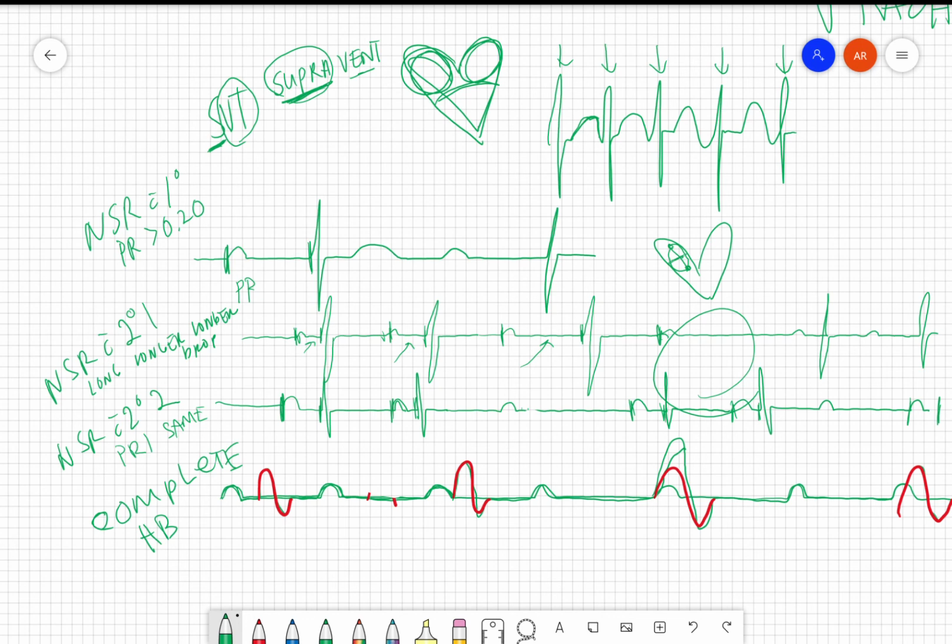So basically what happens is our ventricle, if we measured out our ventricles, this one's beating here, here, and it's pretty rhythmic itself. The P waves have their own interval. So the P waves are going when they're supposed to. The atria is sending its signal like it's supposed to. But then the ventricle is like, I don't hear you at all.